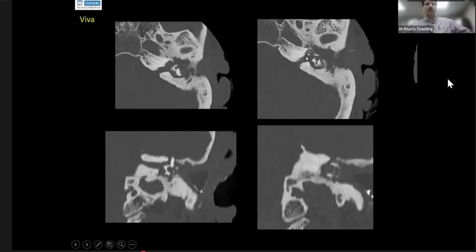This part of anatomy, where are we? Landmark is this. Landmark is this. So we're in the inner ear. Yeah. Is the inner ear normal?